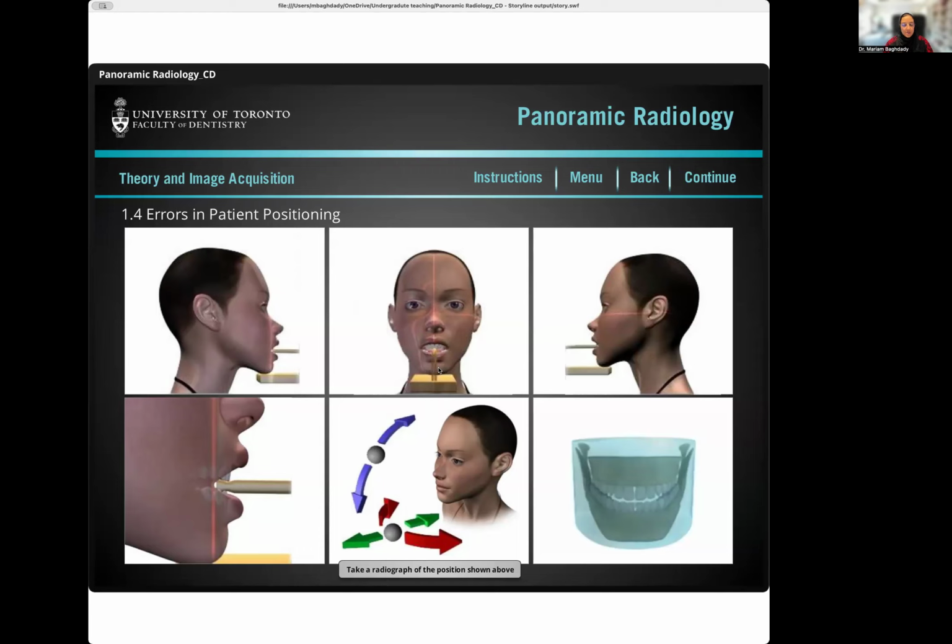The one in the center is going to make sure that the patient's mid-sagittal plane is right, that they aren't rotated to one side or the other, or tilted to one side or the other, right? Your alatragus line is going to help you know if the patient is tilted upwards or downwards, right? So chin up and chin down. Now, the canine line is the two lines over here. They're going to make sure that you're not too far forward and not too far backwards, okay?